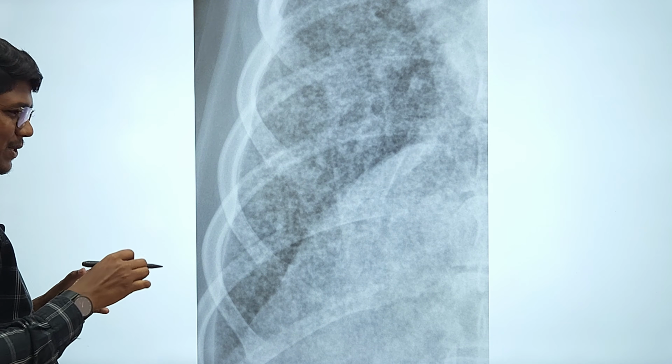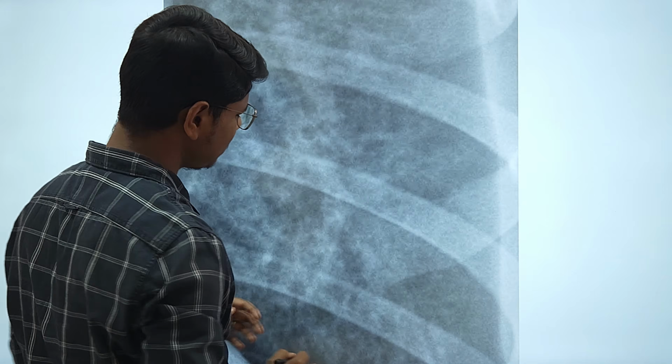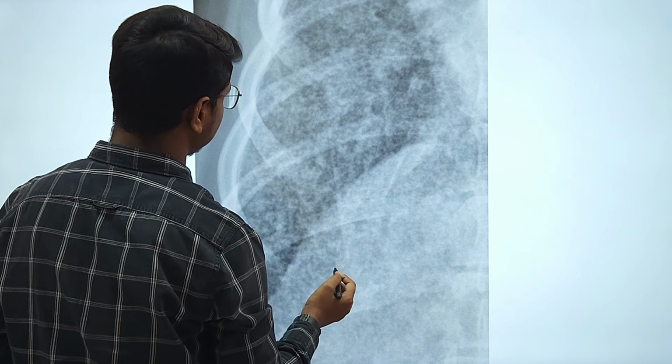In that book particularly, while reading, it was found that to identify lung lesions, especially these patterns, you need to train your eye. You have to see thousands of radiographs, then only you can identify this unstructured pattern. So you have to look at radiographs. You cannot be a pro just watching this video, definitely. But it will give you a hint so that you can see multiple radiographs and become a specialist.